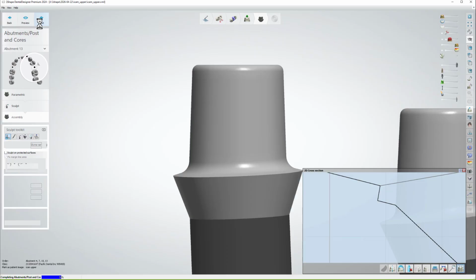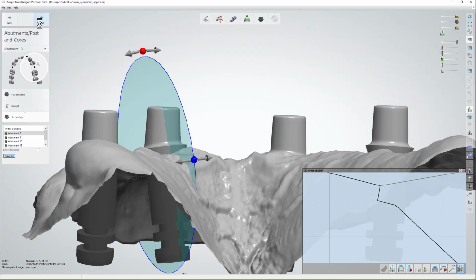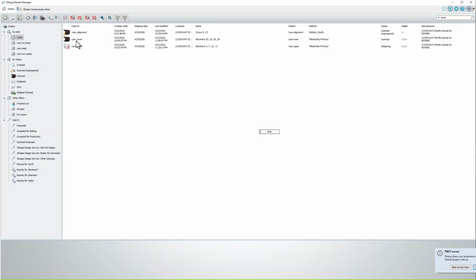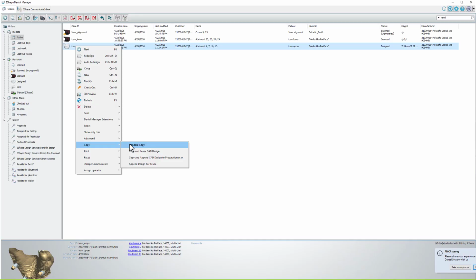Now, this is just a test on can you switch libraries? Because I scan with DES scan bodies. I aligned everything with the DES scan body in the Icam software. I have to use DES. Well, do we? Has anybody checked, confirmed, done anything? So there's your DES.